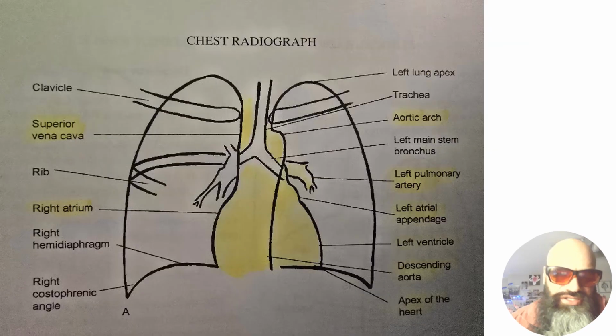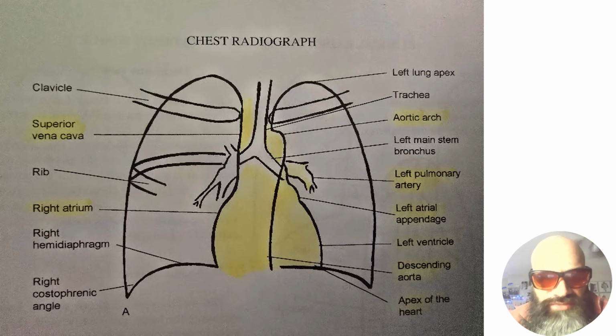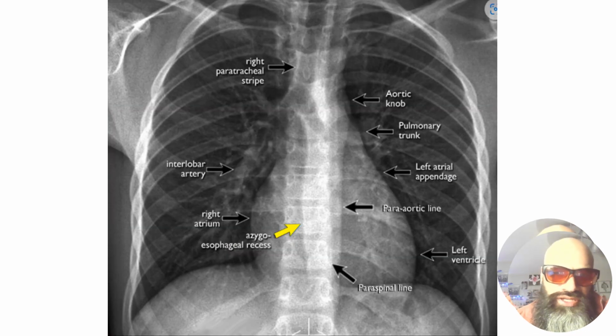This is a schematic here of a chest radiograph to help guide you through your journey of evaluating chest x-rays. You can refer to this as needed. It's in a more simplistic manner, but it's also helpful to guide you as far as where things may be located. Now, I know I explained to you in the announcement that in order for you to understand abnormal, you will need to get a thorough understanding of normal.